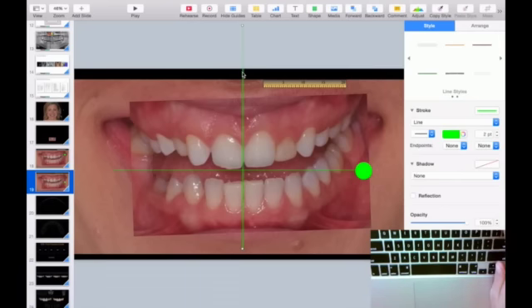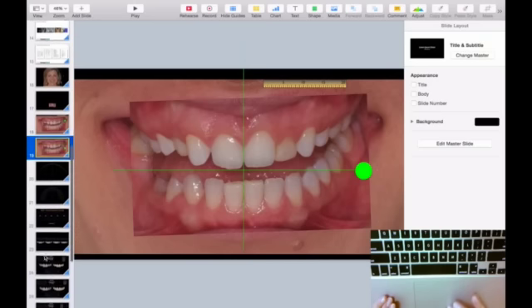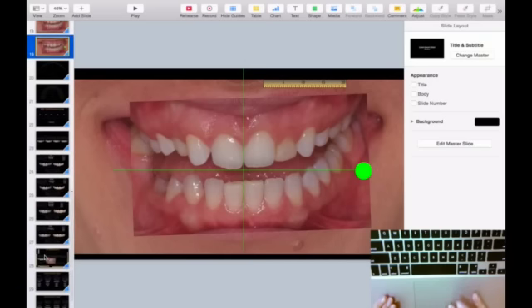And if it's at most 2 millimeters off, you can leave it where it is because no one is going to notice. Just make sure, as I said, it's not tilted. Okay, so we have this already. Our bow is here. We have the occlusal plane and the horizontal plane, and we already know where to start. So now we have to make sure we have the right curve for the smile and the proportions.